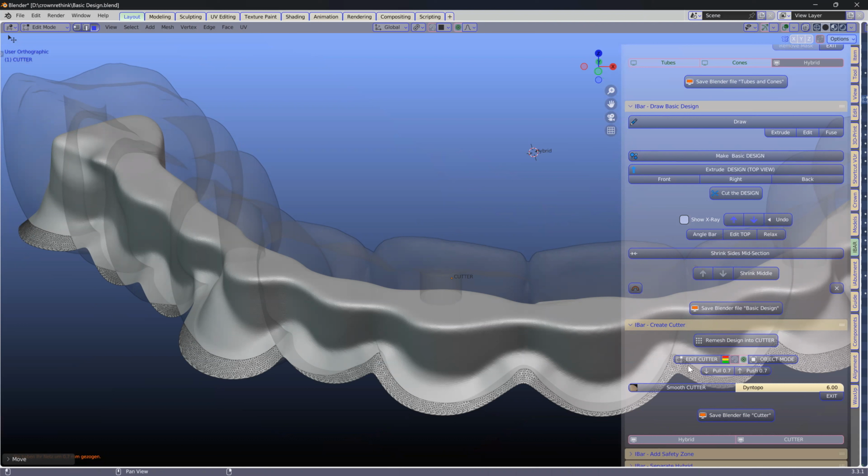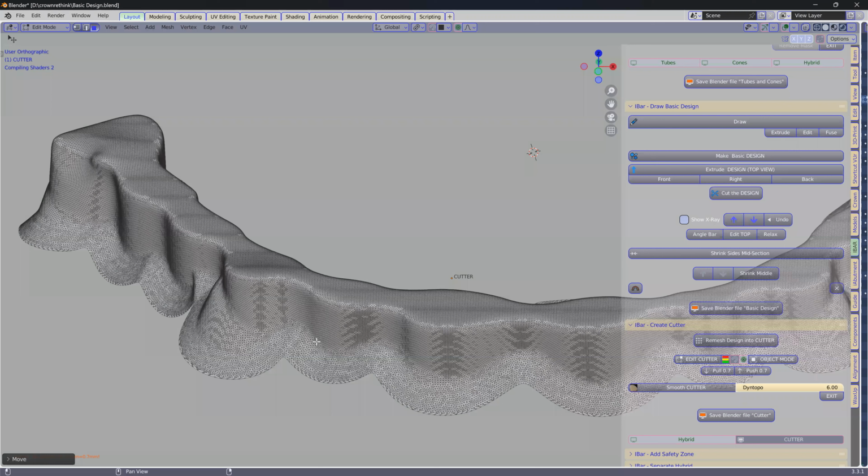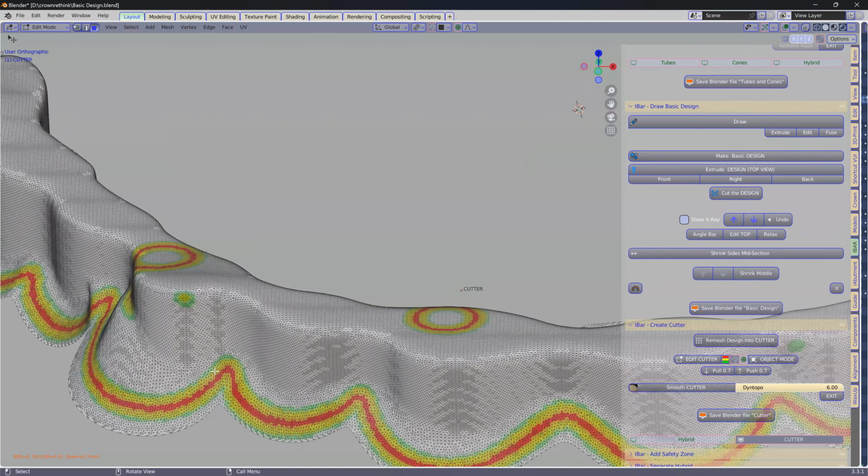And you can view the minimum thickness when you go on the heat map. So if you click on the heat map here, you'll see that 0.7 is the mark, the green is 0.7. Okay. So you don't want anything thinner than that.